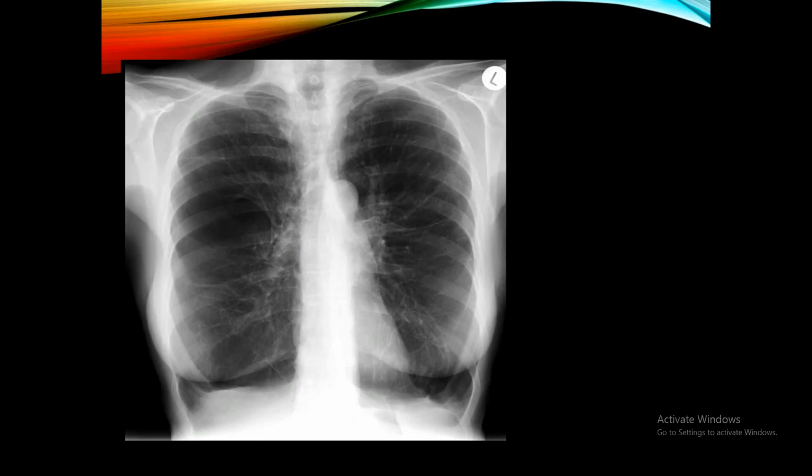إذا نلاحظ في هذه chest x-ray الواضح أنه both lungs showing increased translucency. There is an increase in the volume in both lungs manifested by tubular shape heart and mediastinum. تشوف أنه الهارت والميدياستاينم مضغوط وشكله tubular. النقطة الثالثة والأهم هي diaphragms. لاحظوا أن shape of the diaphragm is abnormal. This is called flat diaphragm. كل هذه signs collectively تنطينا diagnosis of the obstructive lung disease and mainly the emphysema.